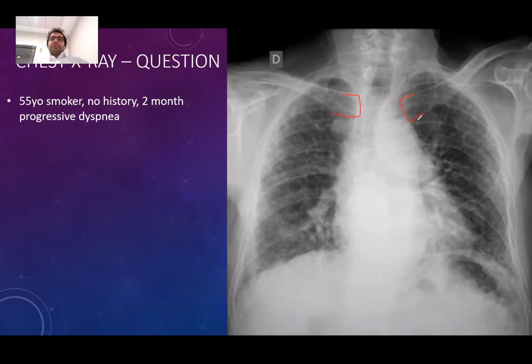There is actually rotation, right? A little bit of rotation. The patient is rotated a little bit to the left. Okay. I should also count the ribs. 1, 2, 3, 4, 5, 6. So it's enough. All right. The dose is good. I can see the vertebral bodies even up to here, and the lungs are okay. The dose is fine, and I can see the apex of the lungs. Okay, 15 seconds: you make the technical evaluation in every patient in an oral exam, okay? You have to make the technical evaluation and see what the shortcomings are and which are good and which are not.